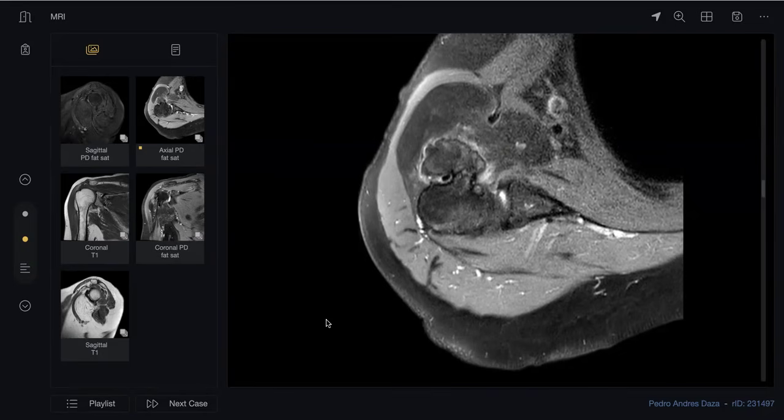Malignant transformation will show the cartilage cap to be thick, more than 2 centimeters, but this is 2 to 3 mm. It doesn't look like a malignant osteochondroma. I'm not really sure about this.